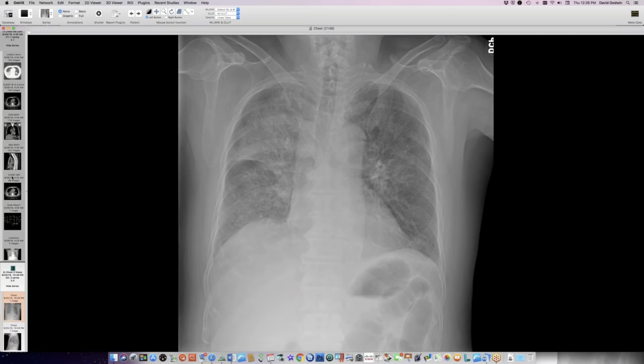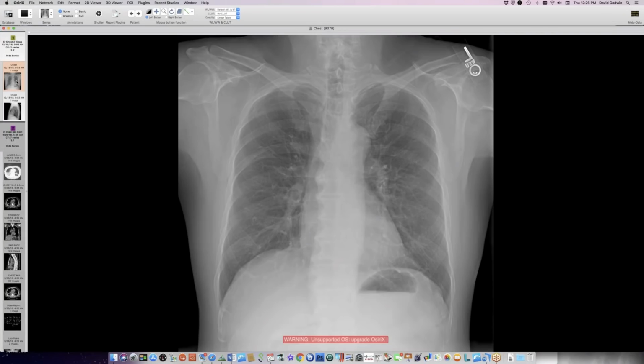So he recovered and he got better, and then he had this follow-up radiograph. This week is what brought him to my attention, and I then found those earlier radiographs this week. So you can see that he's almost completely clear. There might be just a little bit of scar in this right upper lobe. So a clean living man, no bad habits, a Buddhist monk and the abbot of this monastery, and he was exposed to water from this problem in digging up their clogged septic system.